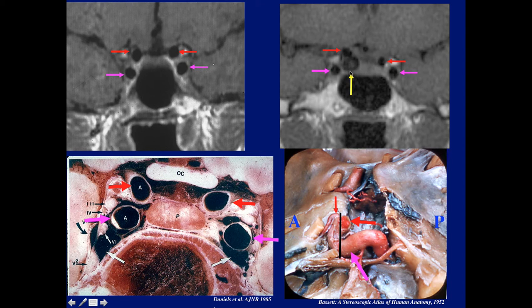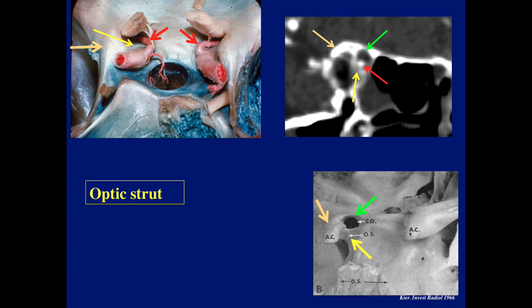Here's an aneurysm, and it's hard to say, is this attached to this, or is it within the cavernous sinus and projecting up a little bit? Will it bleed into the subarachnoid space, or will it just cause problems within the cavernous sinus? So MR has not been that helpful most of the time to detect where exactly the aneurysms are.